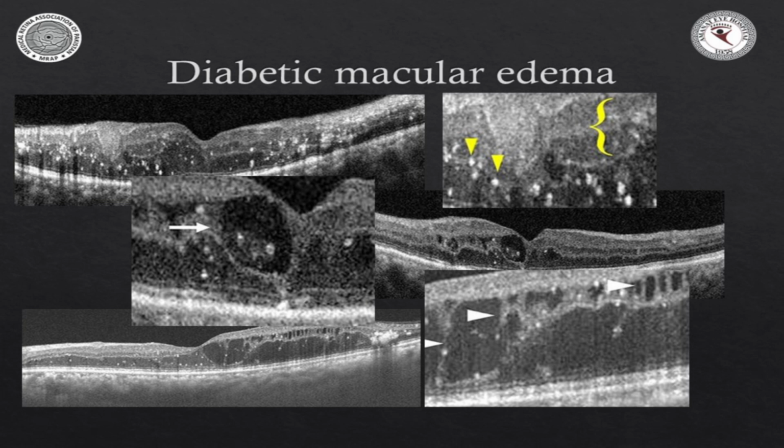So if you've got the pearl necklace sign and you've got hyperreflective foci within the cysts, you know कि यहाँ पे in the long run hard exudate बनने लगे अगर ये patient treat नहीं होता. और अगर hard exudate is anywhere close to the foveal center like this, तो we all have been there where we've got central hard exudates जिनको आप जितने टीके लगा लें वो ठीक नहीं होते. They herniate into even the subretinal space. I'll be showing you a diagram on that.